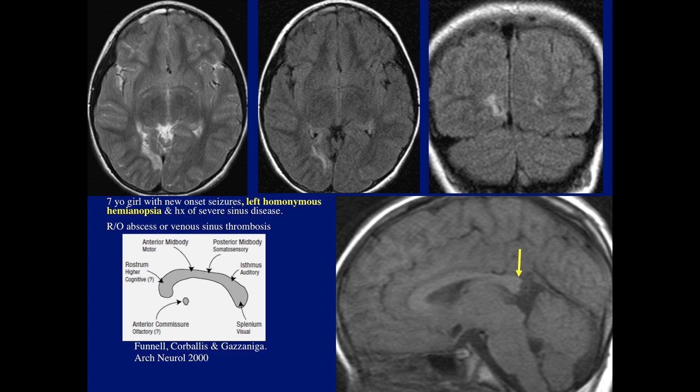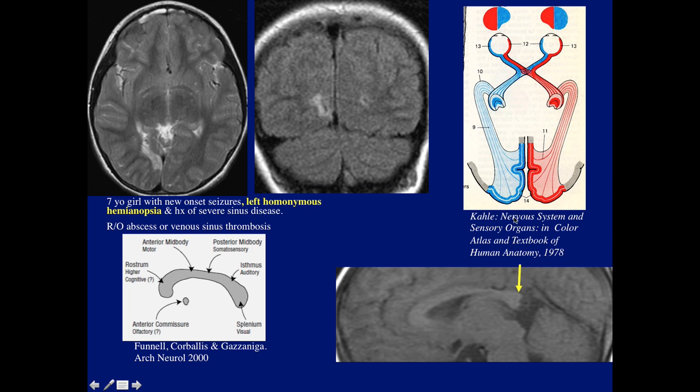And the patient actually did well, and there were no other issues except the visual, the left hemianopsia. And we can see why here, because of the involvement of the medial occipital lobe. So this was the clue. As soon as I saw this appearance of the corpus callosum, I knew that this was a chronic lesion and the symptoms were not due to anything acute.